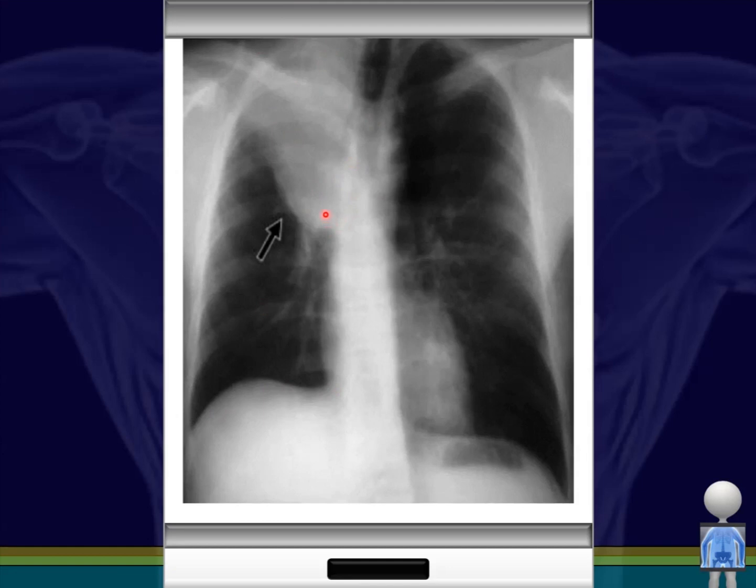The other thing that makes this atelectasis is if this was a pneumonia and the patient was sitting up, over time obviously, then the lower part of the lobe would be infected too. So this is where the lobe is, but it's actually collapsed upwards. Okay, so in pneumonia you don't have the volume loss, and therefore the lobe doesn't change shape as it pulls everything up. It would stay this way, the diaphragm would be low, and then this consolidation would be more like this. But instead, this whole lobe now is not ventilated, is not open, and is stuck together. The other lobes are brought upward, and so is the diaphragm at the same time.